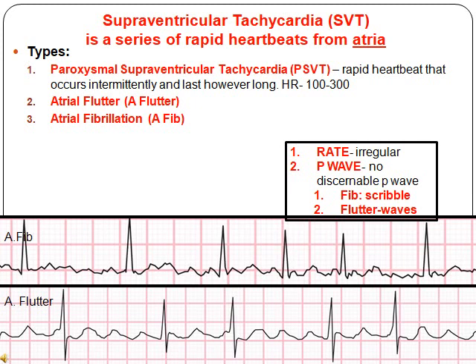A hint to remember this is to think of fib, someone who's lying, trying to erase what they scribbled. And flutter, when you think of flutter, think of a dolphin, they're making waves, not scribbles.